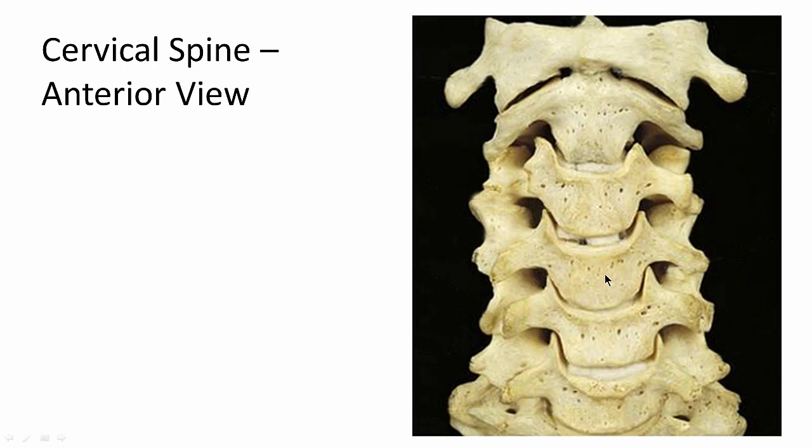What else can we show you here? Oh, we can show you the neuroforamen here. It's a neuroforamen between C3 and C4, so you could call it the C3-4 neuroforamina, or you can call them intervertebral foramen or IVFs as well. And now we can kind of see that trough, right? This is where the spinal nerve would come out. The anterior division, or the anterior ramus, would come right through here.